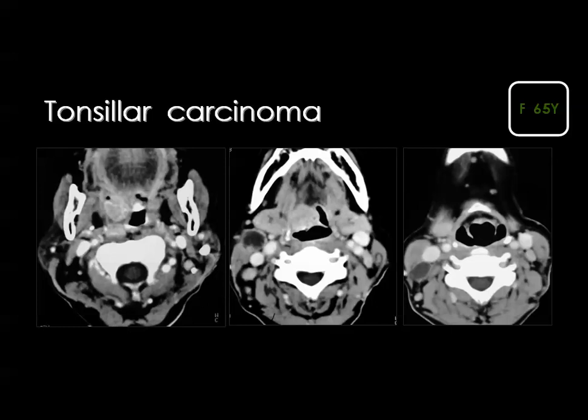Tonsils can be the seat of carcinoma as well. Any mass arising medial to the parapharyngeal fat from the wall of the pharynx should be considered as carcinoma until proved otherwise. And this is a mass in the region of the tonsil along the lateral wall of the oropharynx. The mass is extending downward, reaching the level of the epiglottis here, and this is the epiglottic folds. This will be discussed in full details in the lecture of the laryngeal imaging.